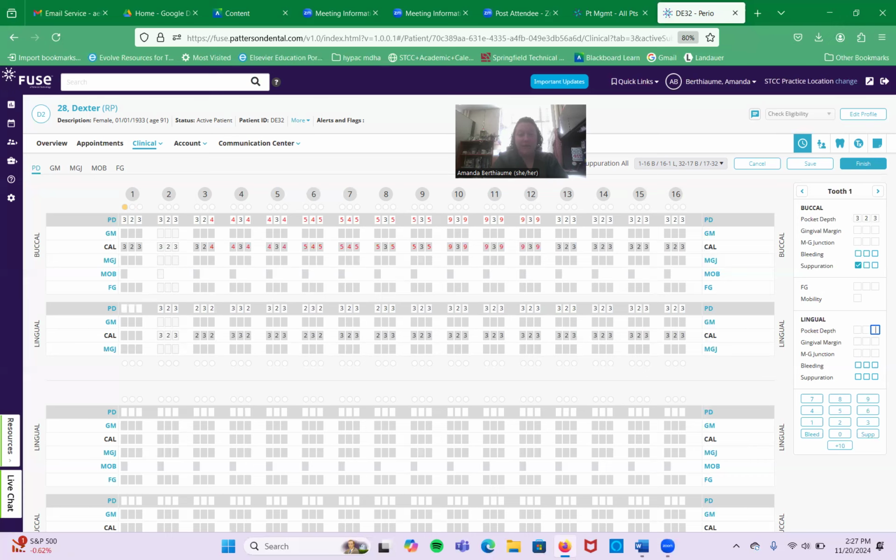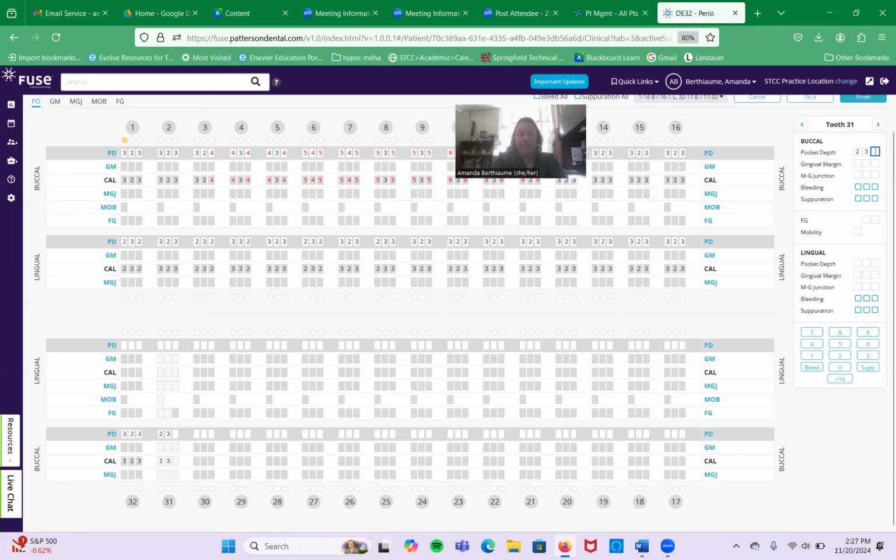After they go through the periodontal depth, it took us all the way across 1 to 16 and then went lingual on 16 and all the way back to 1. It'll do the same for the mandible. It'll go from 32 to 17 on the buccal. You'll go across inputting their numbers, and then it goes 17 back to 32 on the lingual.